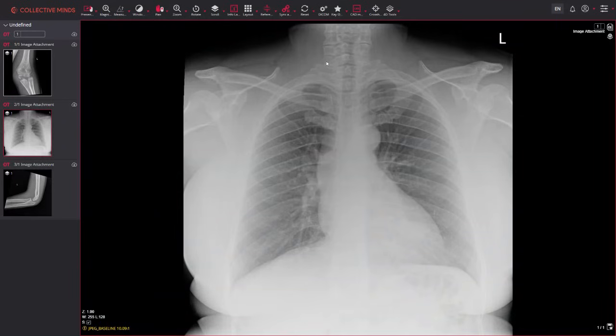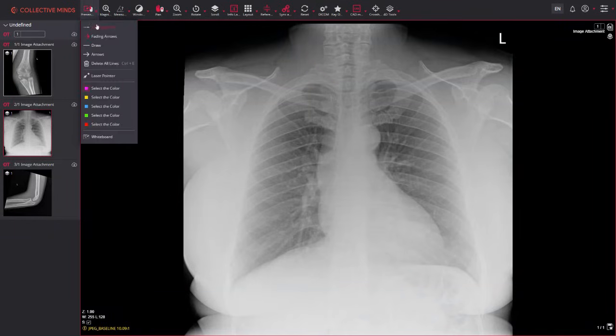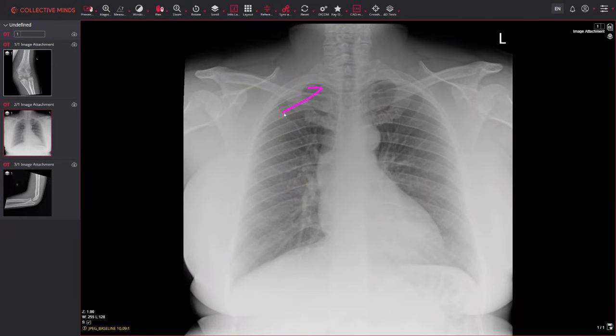So once we've done all those checks, the exposure's fine, the collimation's fine, with no rotation, ID's okay, marker fine, we've got enough images, then we can finally start looking at the different areas for pathology. What I like to do is check the lungs. So I zigzag down. I've already said, remember to check those hidden areas.